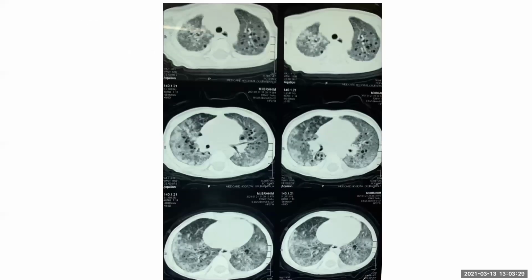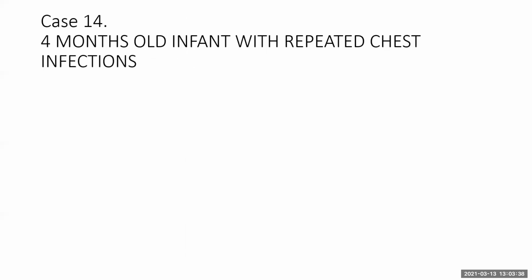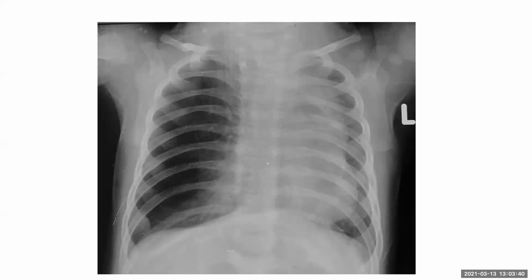You're welcome. Madam, there are a few questions. Yes, sure. Regarding the congenital lobar emphysema, somebody is wondering, was there anything wrong with the right clavicle? No. If you're talking about this, I think this is probably some rotation there. This always comes end on like this. This area where there is the curve on the clavicle, it comes end on like this if there is rotation.